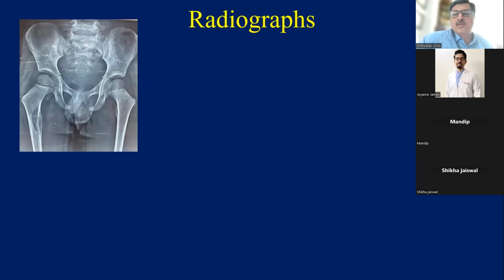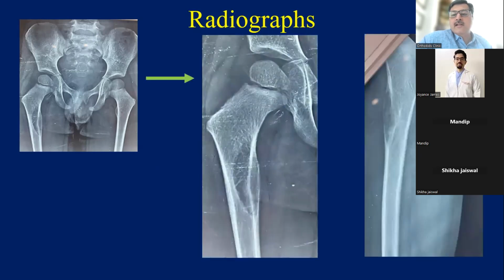Yeah, go ahead and show the zoom in view and this lateral. Okay, so Ankur, just read this X-ray for us. This was a bit confusing picture, because this is intramedullary and intracortical also. It is a well-demarcated lesion with a narrow zone of transition, but there are areas of cortical thinning and even some minimal periosteal reaction, probably at the medial aspect of the lesion, which is extending up to the cortex, but I can't see any significant extraosseous soft tissue component or defect in the bone.